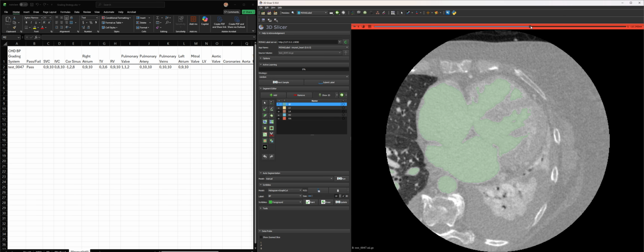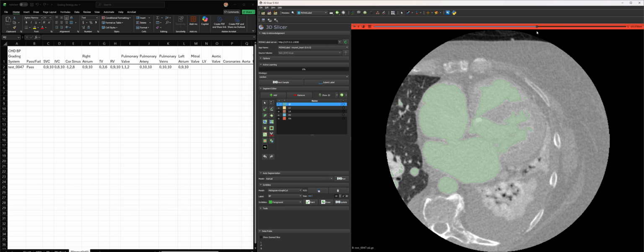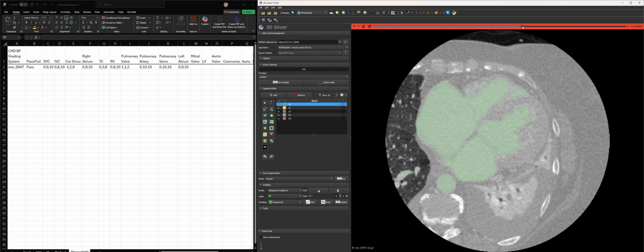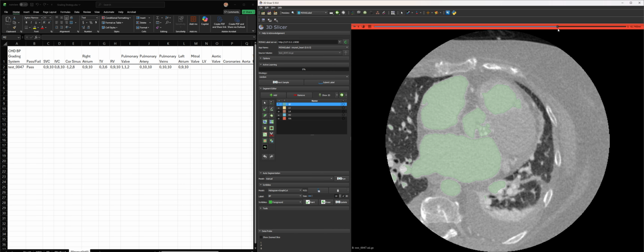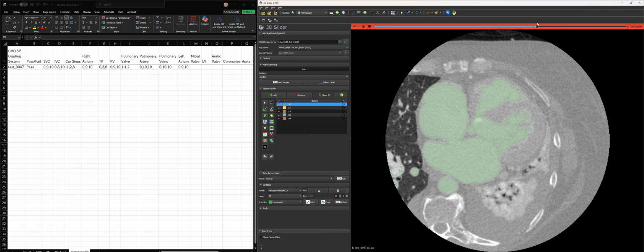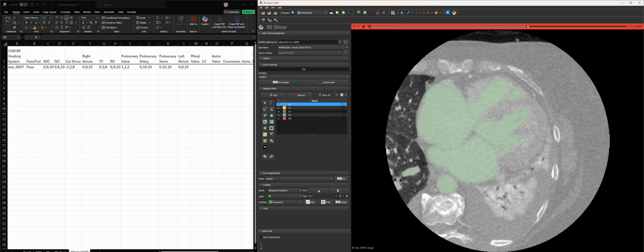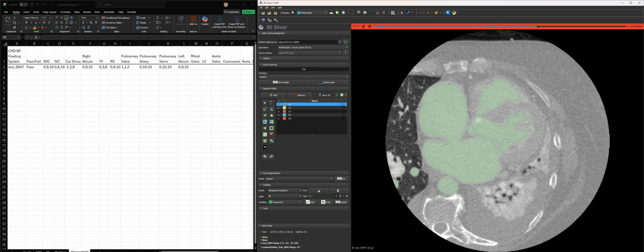And there's certainly a lot of it, so it's a pass, because if all I could see was that, I would say I know where that mitral valve is. So that's a pass, and it does a decent job of it. I mean, if I say it's a 9, that's maybe a 6 or 7, either one. I'm kind of talking myself into a 7. 0, 7, 7. Oh, no, what did I say? 0, 7, 9.